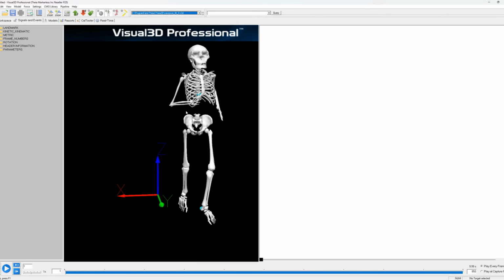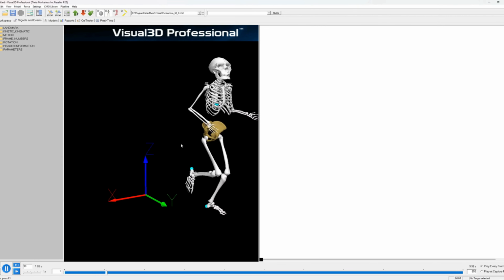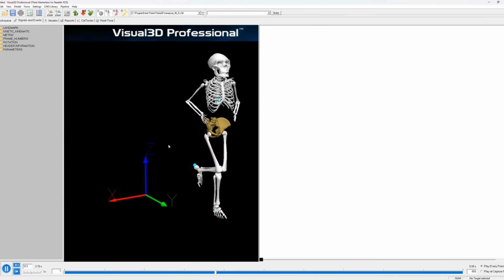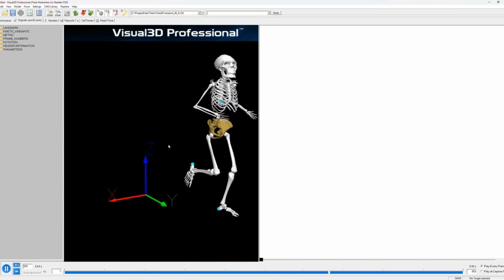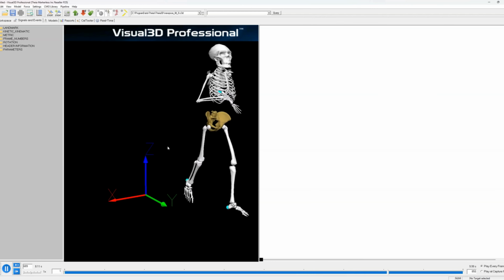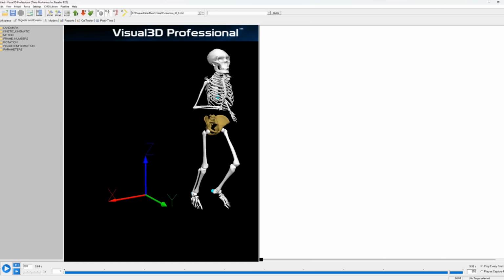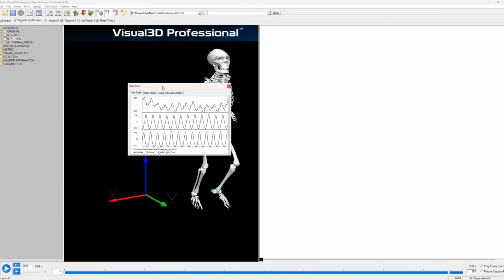The Visual3D model makes use of the individual's anthropometric scaling determined by Theia3D, and uses 6 degrees of freedom segments to allow the predefined joint constraints from Theia3D to constrain the movement rather than imposing additional constraints. When viewing your movement data in the Signals and Events tab, there are several signals available from the automatically generated model. These include landmarks for the left and right heel, which can be useful for generating kinematic gait events, and kinetic-kinematic folders for each of the model segments as would be created for a manually defined model in Visual3D.